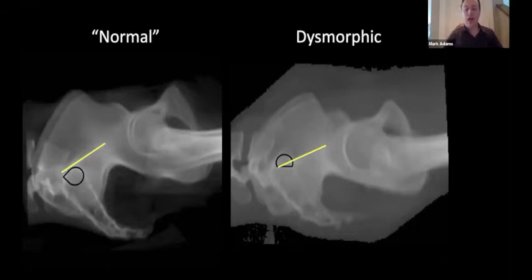Furthermore, this osseous fixation pathway in the dysmorphic sacrum cannot run uninterrupted from one ilium to the other, as the majority of this oblique osseous fixation pathway in the dysmorphic pelvis is cranial to that iliac cortical density. In other words, the acute alar slope does not correlate with the iliac cortical density. However, in the normal pelvis, the alar slope corresponds with the iliac cortical density.